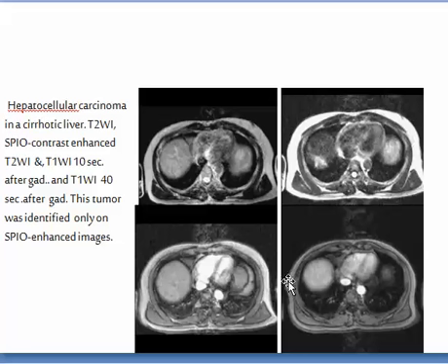This is 10 seconds and this is 40 seconds. It fails to show except hardly, while in T2 it is again difficult to be seen, while this one with contrast is apparent. So sometimes you need to give special type of contrast.